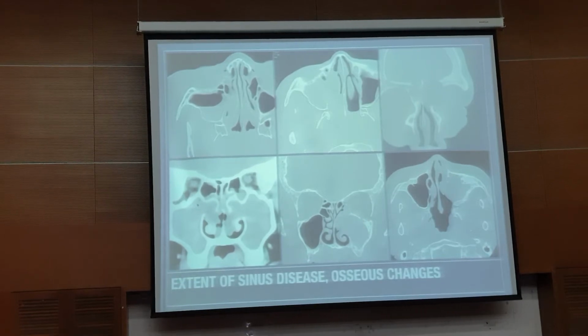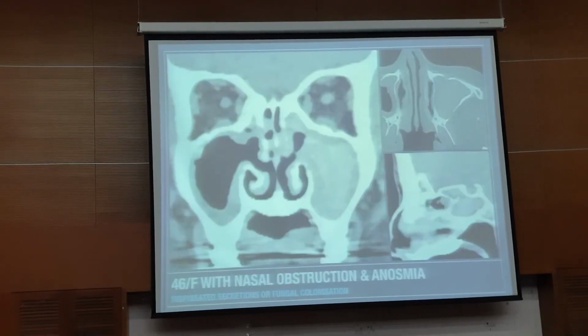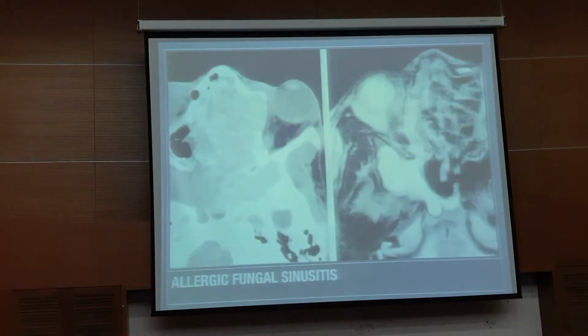But if the patient has certain symptoms and you see a very classic expansion of the sinuses with often a very hypodense mucosa around it, not quite like this one, you see this kind of hyperdensity and a little bit of mucosa around it that's hypodense. In the right patient, you may be able to suggest fungal material.